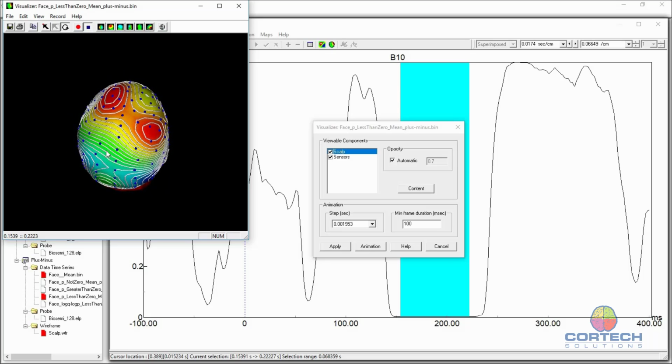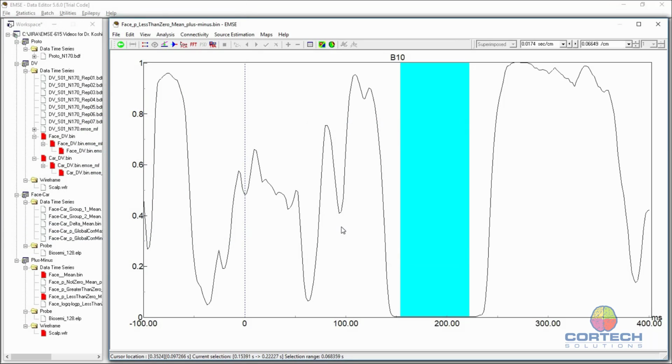Since these are uncorrected values, the flip side of this is the positive p-values that are close to 1. These are also significant in the other direction. However, with the caveat that it hasn't been corrected for multiple comparisons. Okay, let's do the same thing for cars.